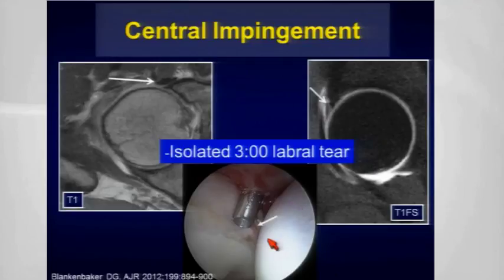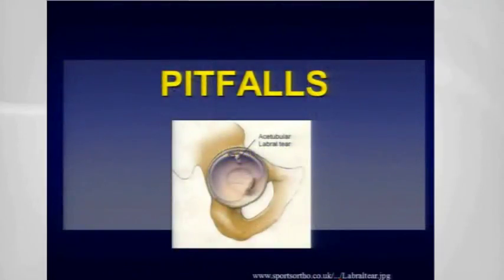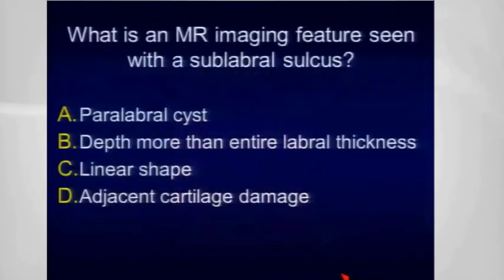So in this patient, here's the femoral head, here's the labrum that's torn, and here's the thickened iliopsoas tendon that was just kind of plopped down and just kind of irritating the anterior labrum. Let's now move on to pitfalls in diagnosing labral tears.